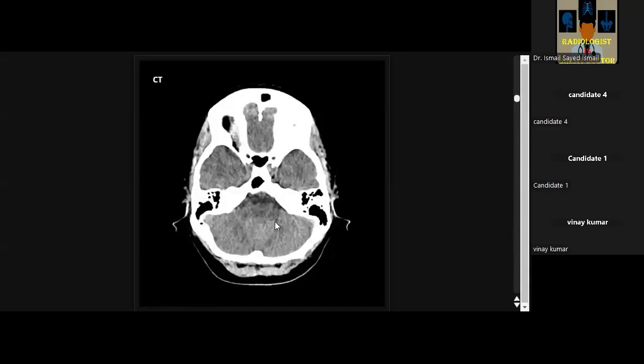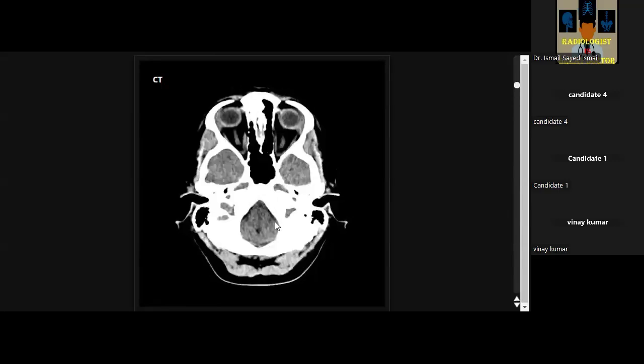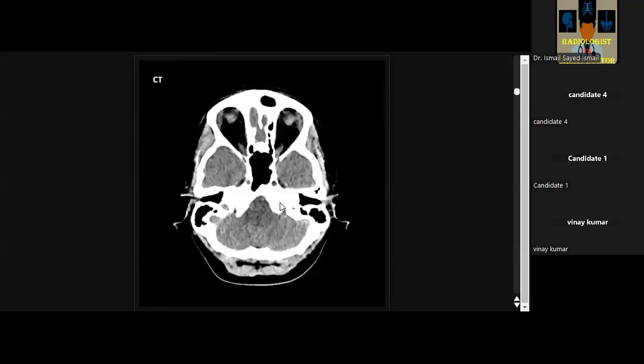Good. So in my routine practice, I also check the bone window and the contrast images. Because of this hydrocephalus, I will pick up the phone and inform the referring physician of my findings and recommend external ventricular drainage by the neurosurgeons. Well, then I'm done, I will compare with previous images. And I'll then give you the MRI of the same patient.